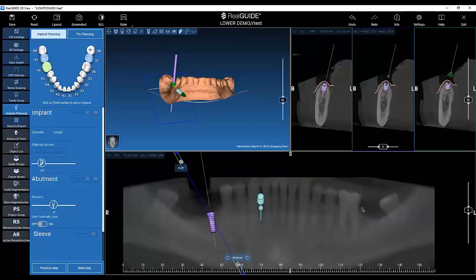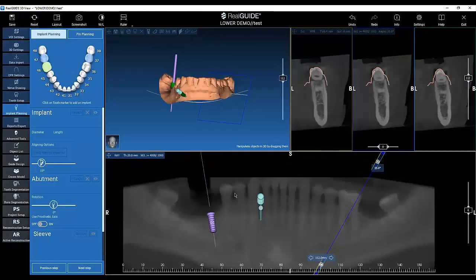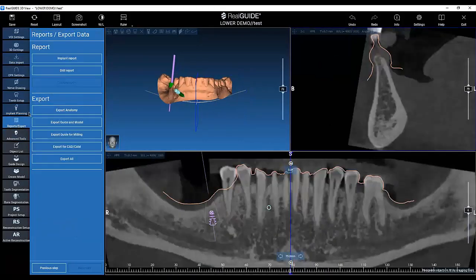Okay. Report. They can't see it now, right? Yeah, we continue to see the software.